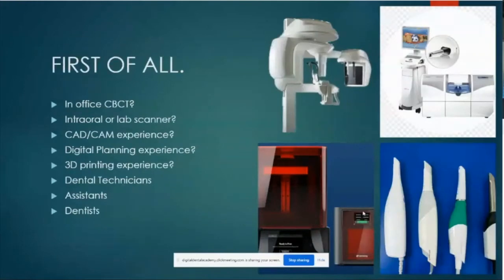Okay. So first of all, I don't know at which point in time you guys are seeing this webinar. However, it's important that you get your hands wet in all the digital dentistry. First thing you need, of course, is a CBCT DICOM file that will give us basically all the bones and cavities of our patients. And then we also need an intraoral or a desktop scan.